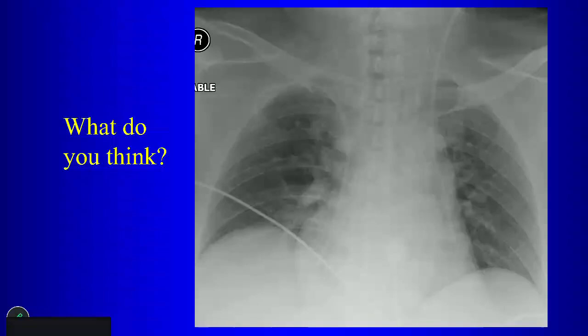So when you see a catheter taking an abnormal course like this, there are some possibilities. One, it might not be intravascular, right? So the first question you would ask is what? If you see a catheter and it's taking an abnormal course, the first question you ask the team is, is there blood return? Right. So that's the first question. Is there blood return from the catheter?